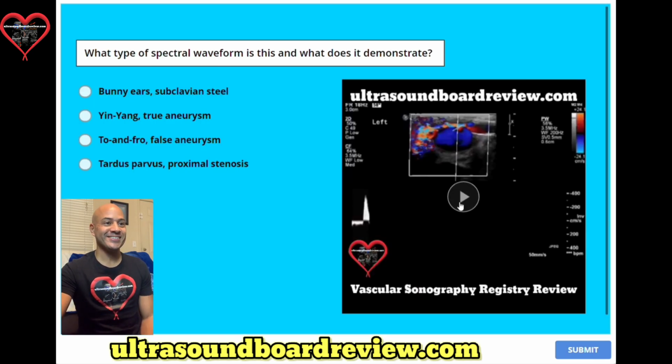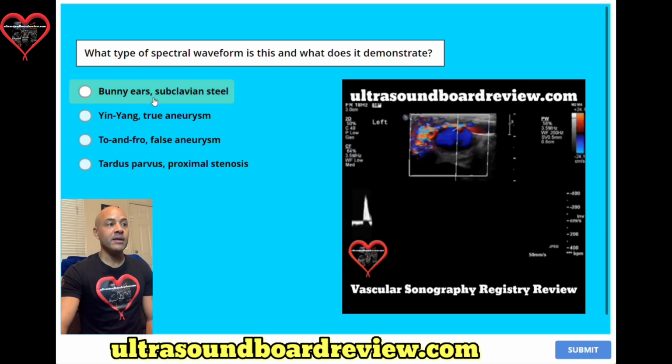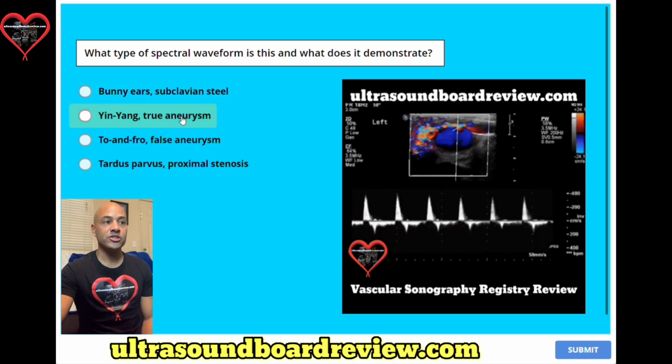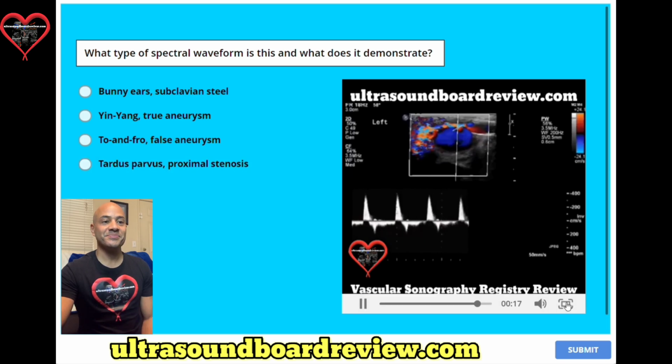Question 76. What type of spectral waveform is this, and what does it demonstrate? A. Bunny ears and subclavian steal. B. Yin-yang and true aneurysm. C. To and fro and false aneurysm. Or is it D. Tardus parvus and proximal stenosis?